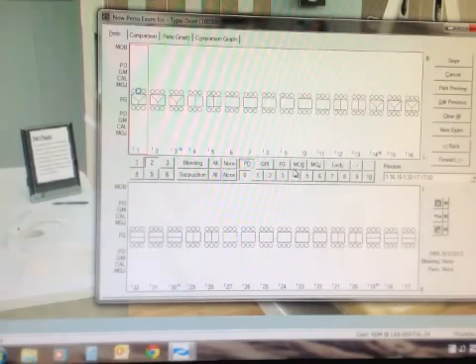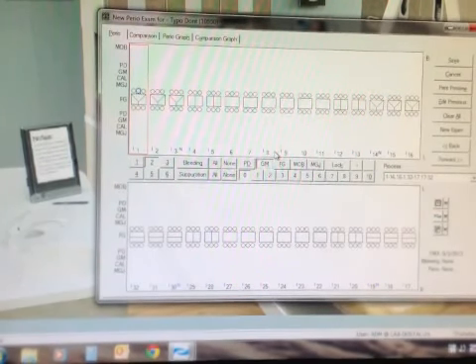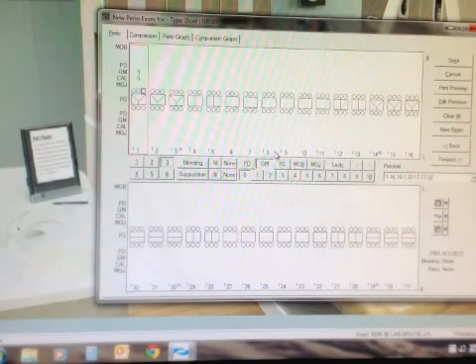After charting the pocket depth measurements, you are able to move on to the gingival margin. Click the GM button and select where there is recession on each tooth that there presents with. For example, tooth number 1 has recession of 5 millimeters.